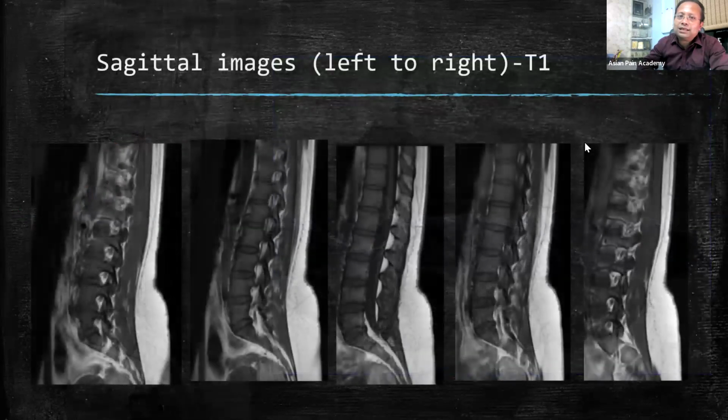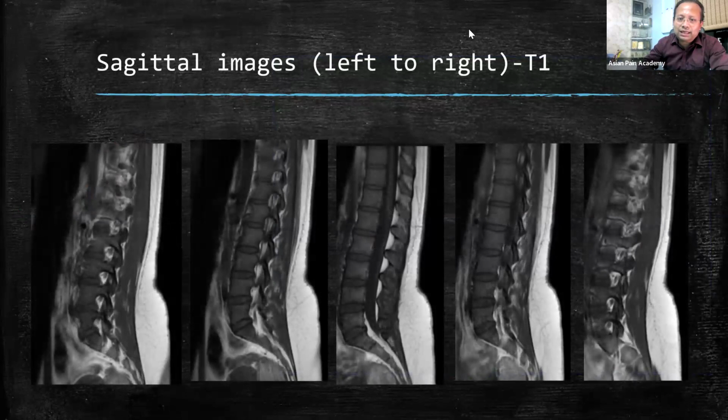Here I just told you that when you see a sagittal plane, how will you immediately understand in which area the sagittal plane has been taken? It can be right foramen, left foramen, lamina, or in the middle, spinous process and all. One way is to see the sequence planning, but otherwise also you should think of other differences which tell you where you are.